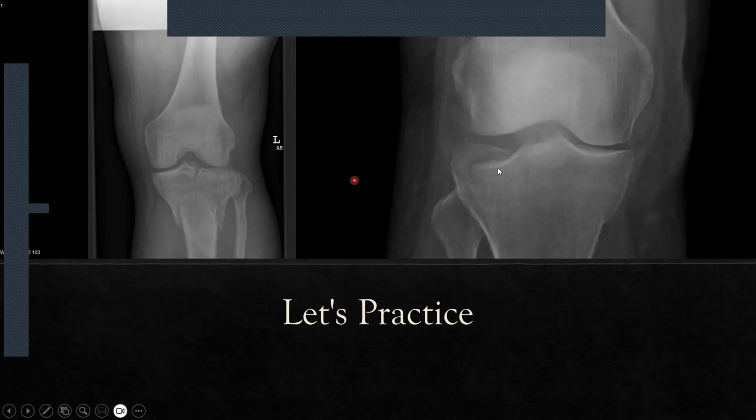And if we go to the second one, this is also one on the lateral end there, and you can see that there is a fracture. And here you can see a slight indentation, which may indicate that there's another occult fracture on the medial end as well. Now, of course, these are ones that you would refer to an orthopedic surgeon. They would have to have a look at the patient and decide what to do, although these are quite obvious.